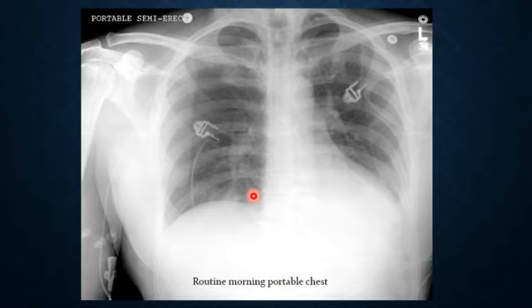Hilum convergence sign. We talked about it. The hilum overlay sign, the hilum convergence sign. You need to do a lateral chest X-ray to confirm sometimes. There is a lot of history. Why was the X-ray done? The basic thing, the history, the most basic thing. You look for either the hilum overlay or hilum convergence sign. You can see it in the previous presentation. It is an X-ray sign, not a CT sign. If I have a CT, I don't need any sign. I will see it directly.